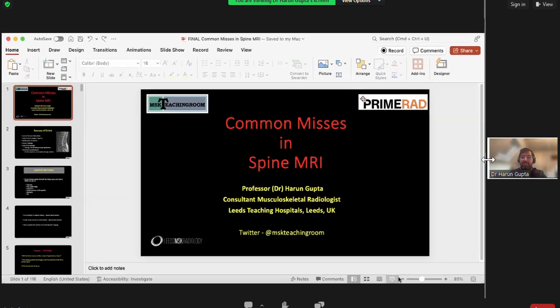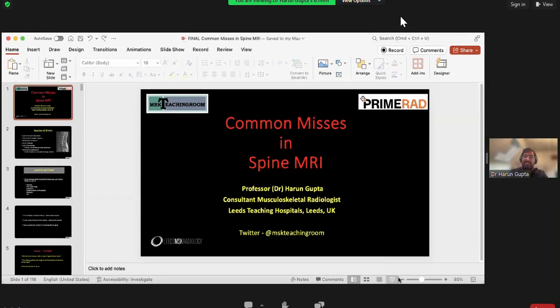by pretty much all subspecialties in radiology. And it is a very straightforward MRI. If you look at spine, the indications is, in our practice, spine is one of the largest volumes of MR which we do, apart from obviously knee and other things. But spine forms a big volume of work we do.